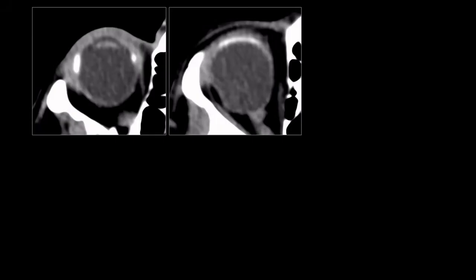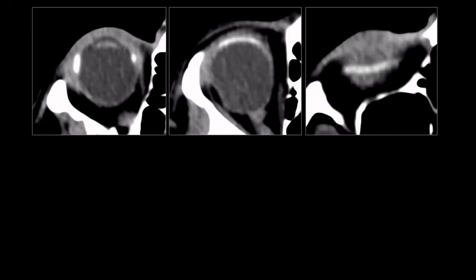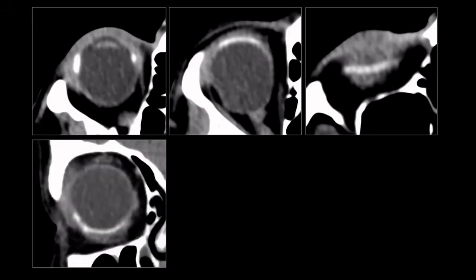At first you'd say yes, but if you look at a few images higher and lower, you see a small band-like rim of density enveloping the entire eyeball. So not just located at the insertion of the medial and lateral rectus muscles. So it was not possible for me to make a reconstruction showing you how it goes around the eyeball completely. This is a coronal image, but you can imagine it does. Okay, so what is this?